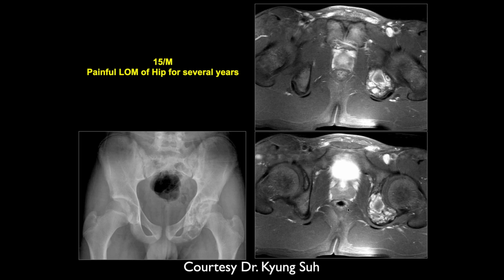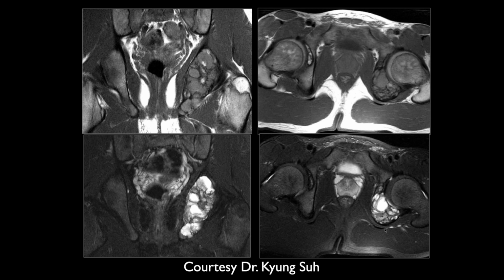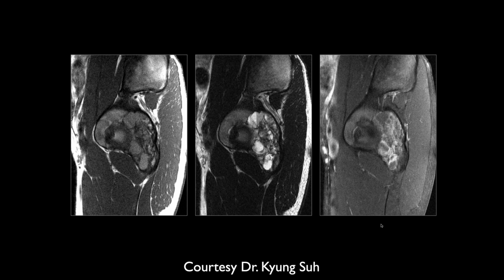Okay, let's now look at miscellaneous lesions. What do you think of this one, Michael? Painful and limited range of motion of the left hip for several years. So yeah, on plain film we see this lesion involving the posterior acetabulum and ischium, and then on MRI we see this expansile lesion within the posterior acetabulum, which is multiseptated. It's predominantly bright on fluid sensitive sequences. On post contrast images, it's got peripheral enhancement of those cystic areas with fluid levels.